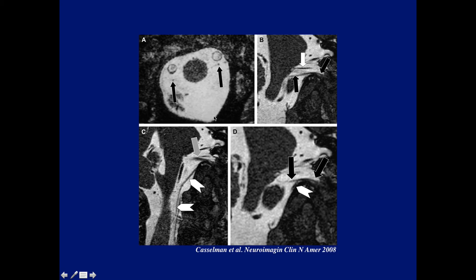And of course, the Europeans again show, here's a spinal accessory nerve on an oblique sagittal. Here's the 11th nerve coming up towards the jugular foramen, where it joins the upper branch, and here it is again. And here it is on the axial, just like I showed before.